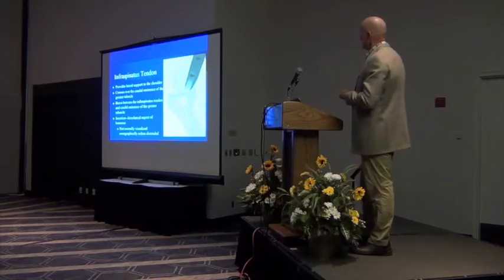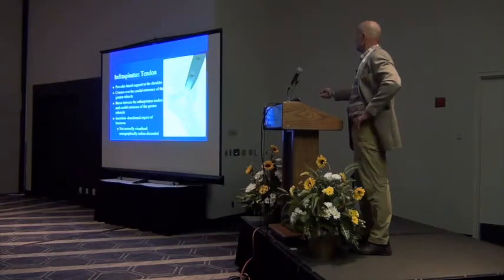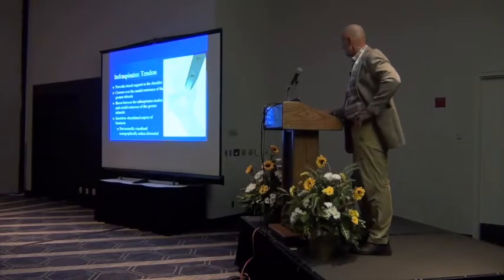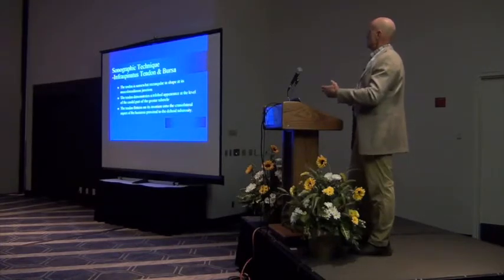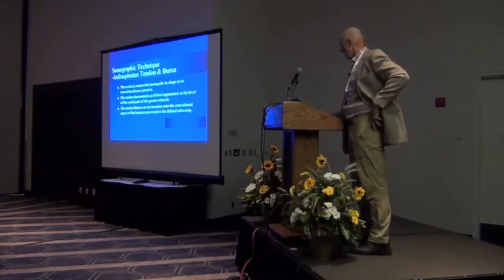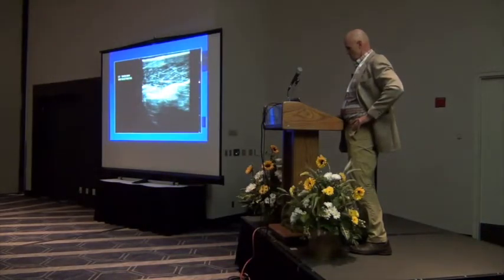Now, the infraspinatus is unique in that it comes across the caudal eminence, and it's going to come down here and attach to the humerus as well. And we won't spend too much time other than to look at it, because it is rectangular in shape in the muscle bundle, like we saw with the supraspinatus, and it comes down and it forms a trilobed appearing tendon as it crosses the greater tubercle. And hopefully you can see that.